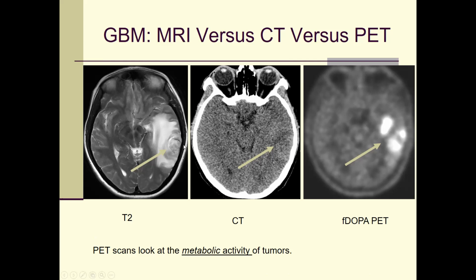So if you go to surgery and remove only this, you're leaving this component of the tumor behind. So we always assess and make sure that these areas of abnormality are not only the edema, but also where the tumor is hiding. And those modalities can help to identify otherwise invisible areas of activity.